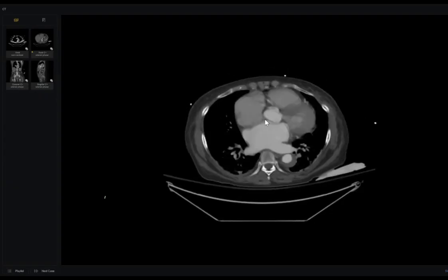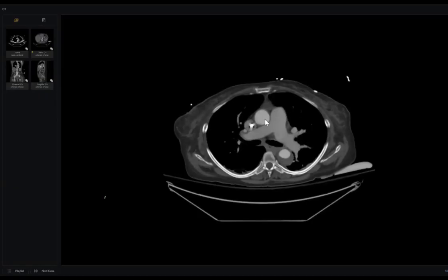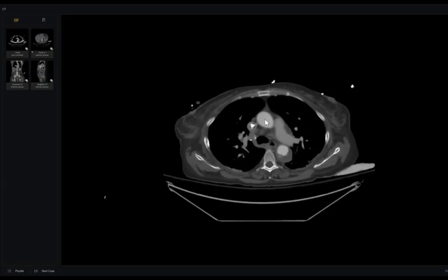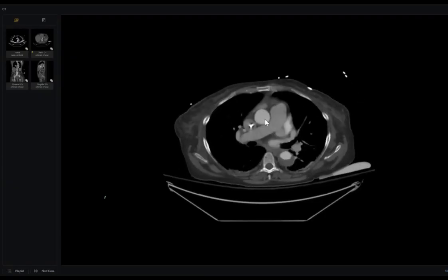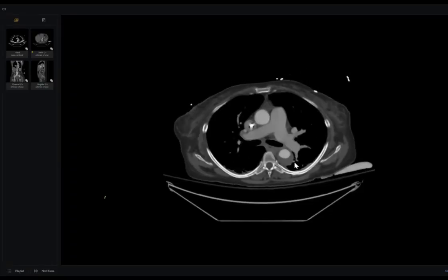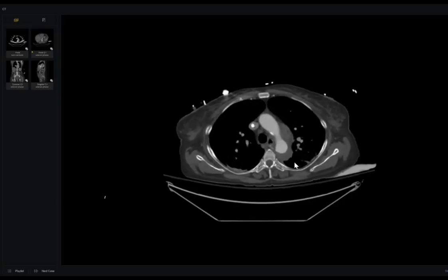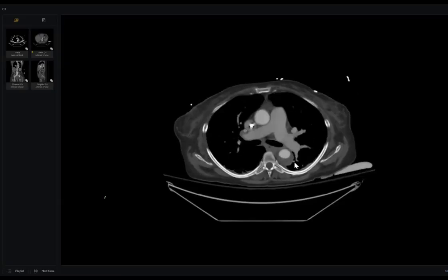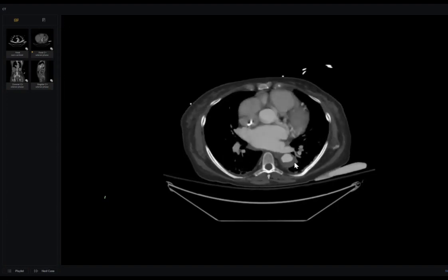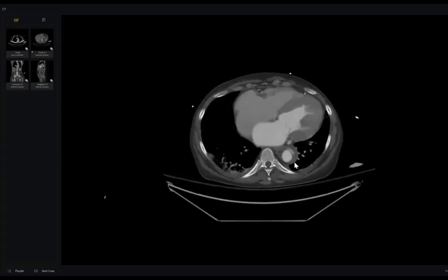Doctor, why is this not atherosclerosis? Sir, don't give me a clinical cause. Radiologically, why is this not atherosclerosis? No, sir, because in atherosclerosis the age of the patient would be more than this, and there would be more calcifications.